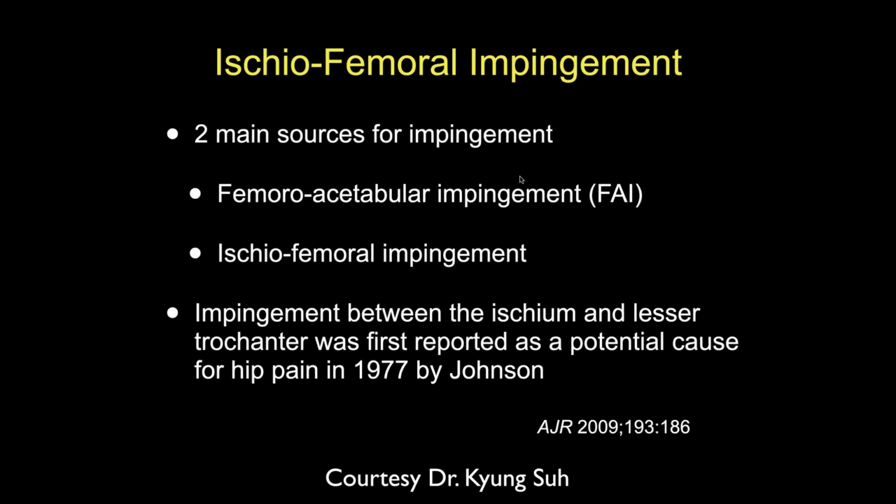Before MR, John, we used to call these snapping psoas. But then we learned what that was. Yeah, well, MRI showed it. I'll show a true iliopsoas snapping syndrome later, which was slightly different, but it's hard clinically to differentiate these. I know you will, but clinically it's very difficult to differentiate these.